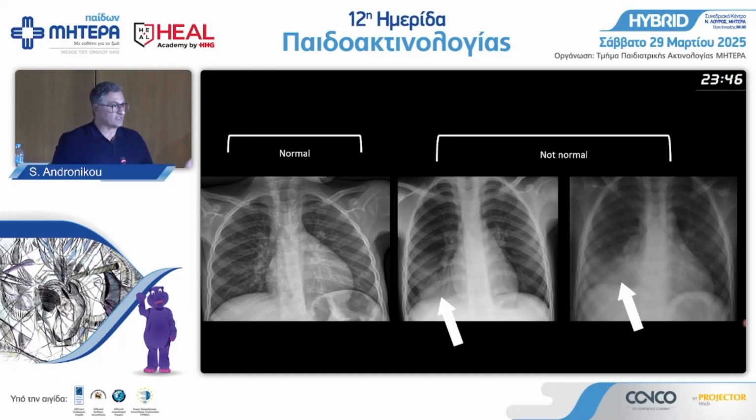And the other, the same thing at the lower lobe, the one in the middle lobe, one in the lower lobe. One of these is tuberculosis, one is just pneumonia. Okay, so you're supposed to make the difference because the treatment is completely different. The one child will get treatment for a week, the other one will get treatment for 6 months, okay, and completely different drugs.